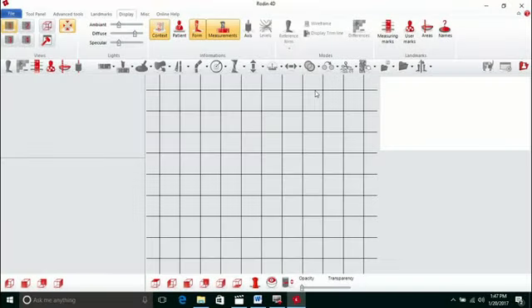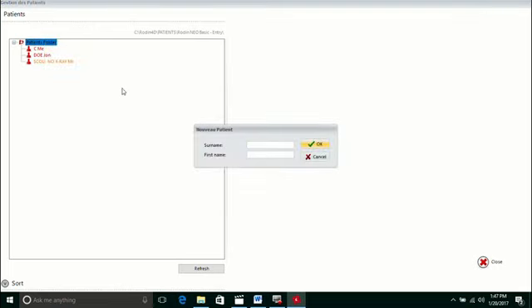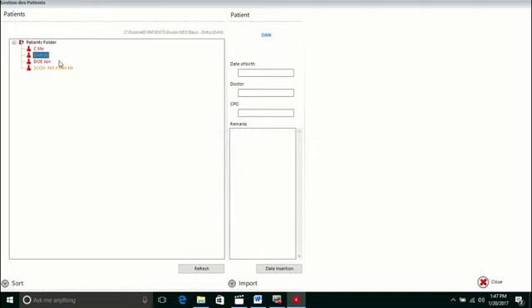Okay, now that you have the AOP and STL exporting down, let's look at importing AOPs and STLs. Alright, to import the AOP, we're going to create a patient folder. So go into your patient manager. Remember, that's the small red folder, or you can go to top menu, file, drop down, patients as well. I'm going to create a patient folder. Click OK. Create your patient folder to the left hand side with the 0 indicates no file or scan attached.